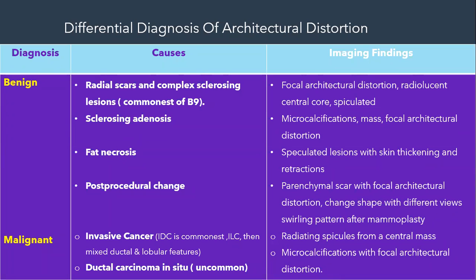Centrally, the skin has a wavy appearance, and the nipples are lifted up and pointing up. It might be associated with complications like seroma, abscess or fat necrosis, and the commonest is fat necrosis. I have seen a lot of mammoplasty patients with fat necrosis.